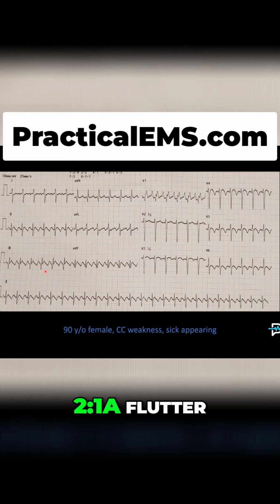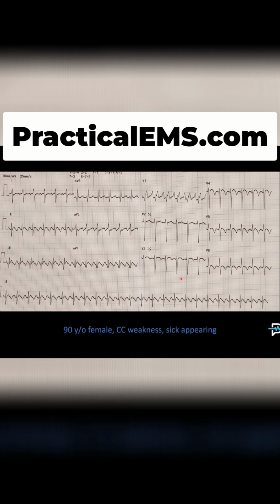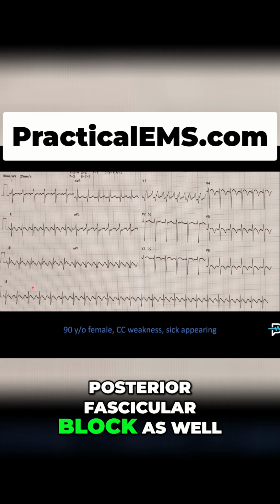So our interpretation is 2-to-1 A-flutter. I don't think sinus tachycardia is probably going on here. We do have a posterior fascicular block as well.